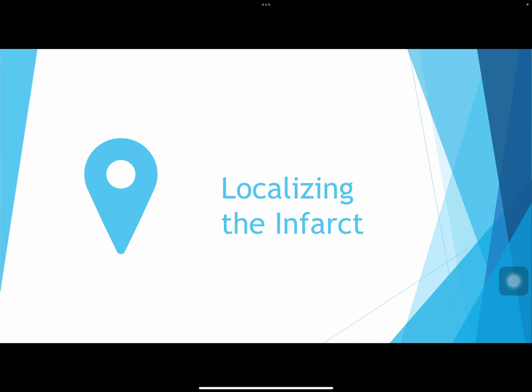Localizing the Infarct. So now we're going to talk about how to localize where an MI may have happened just based on an EKG. As I mentioned before, this isn't a section where I expect you to be able to really recognize. We're going to do it for fun, for an assignment, and just see how much you take away from the different leads, to see if you can get where the infarct may have happened.